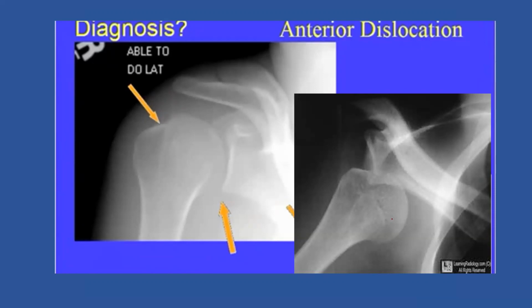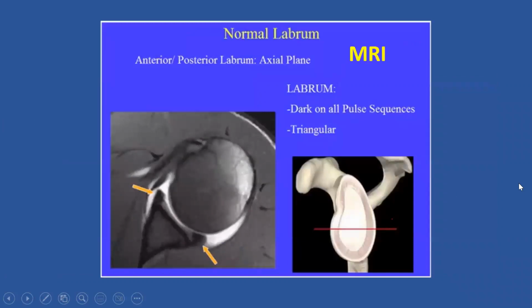This shows you how this patient developed a Hill-Sachs lesion, which is a defect due to impingement of the upper end of the humeral head on the antero-inferior aspect of the glenoid. You see the head over here. I don't know whether my pointer will show it. You see it impinging on the antero-inferior aspect of the glenoid, and as a result, you get an erosion of bone.